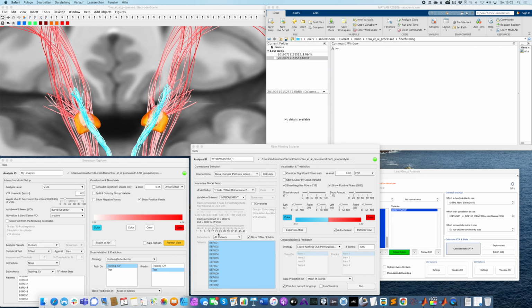So here we have to assure that the tracts are at least connected to something like 20% and not more than 80% of the VTAs, so that it divides the group of VTAs into 2 groups that are at least of some size, right? So something like this would probably not make sense, because then we would compare also tracts that divide the group into very unhomogeneous sizes.